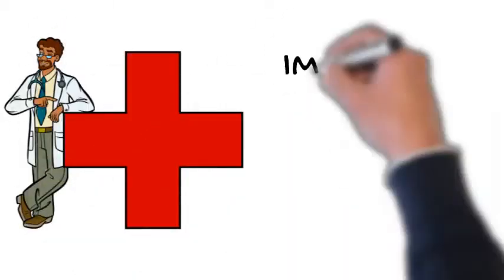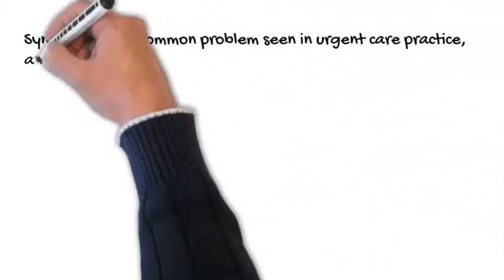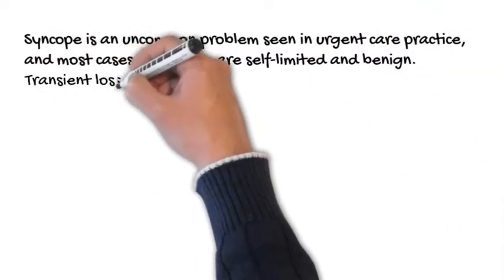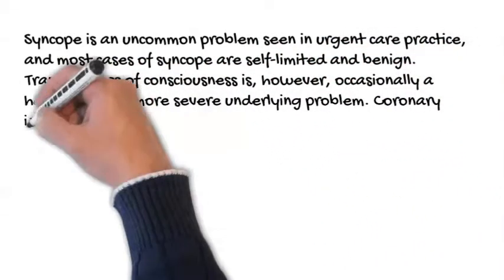Important ECG findings in patients with syncope. Syncope is an uncommon problem seen in urgent care practice, and most cases of syncope are self-limited and benign. Transient loss of consciousness is, however, occasionally a harbinger of a more severe underlying problem.